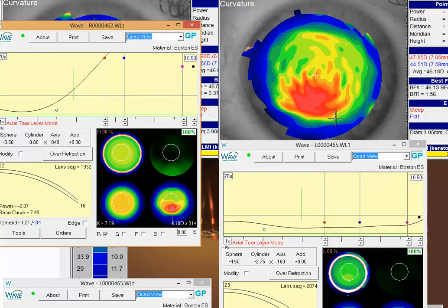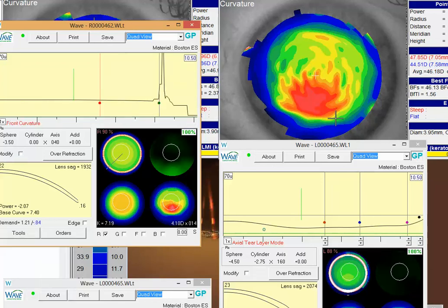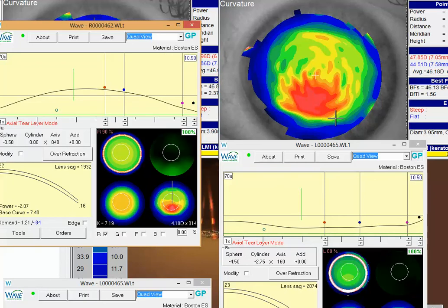So if you look at this Wave design, I set this back surface at about 5.5 or 6, and if you look at that, it puts you outside the cone. So I like to put it somewhere just outside the cone, and again leave about a millimeter or so between the red and the blue. Let Wave do its design, and you come up with a spherical back surface. And really what I'm looking for is not so much how this line relates to the green line, because we know it's not going to be perfect since we have such a displaced cone.